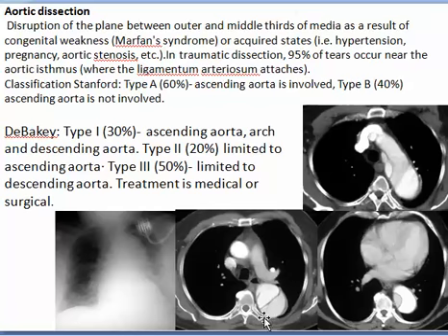Here you can find the intimal flap and the change of caliber between the ascending and the descending. Normally the descending is less in caliber than the ascending. Here it is more apparent that it's larger. Definitely there is very big unfolding of the aorta and widening of the superior mediastinum, indicating an underlying aneurysm. More than one intimal flap, one here and one there, with intramural hemorrhage.